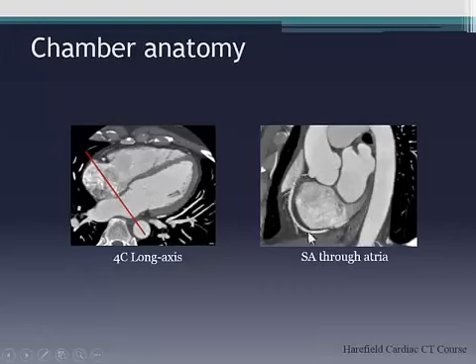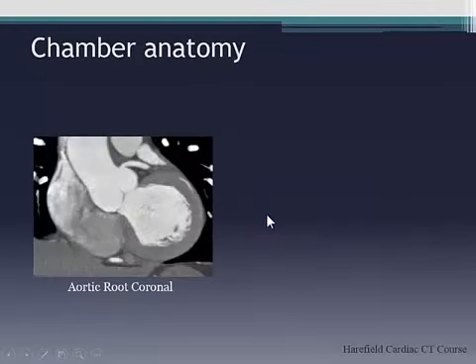Okay, this is also something called a C view, which I'm sure I'll show you, but Taryn doesn't like me showing you because it confuses everyone. I thought I'd get that in now.